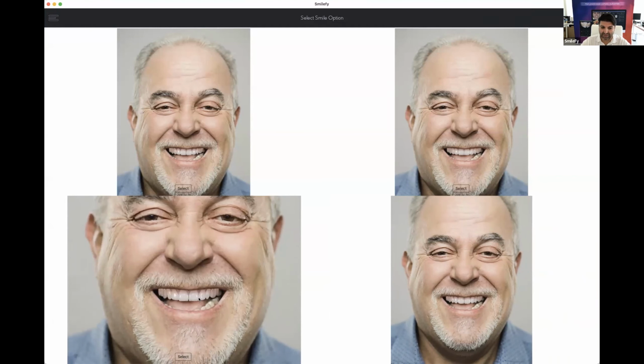If we don't have the frontal position to the camera, then the angulation of the 2D shapes that we use as a 2D design is created on a picture on the templates that are always frontal to the camera. So if this is my shape frontal to the screen, and the head of the patient is like this or rotated to the side, this is not a representation of the 3D template rotate.